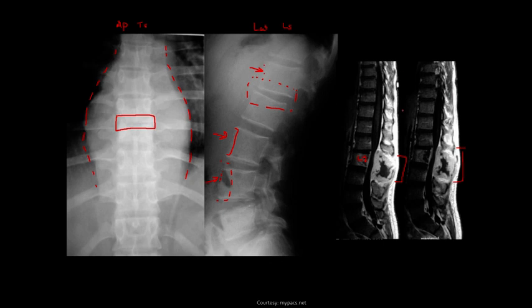These are not the same person, by the way. Two different cases. No, actually they're probably the same person because I don't see any posterior elements here. So this is the same as this region. So it is the same. This is a T1 image, and we're starting to lose that more normal marrow signal. So that's consistent with some inflammatory change on these anterior aspects, with these areas I talked about.